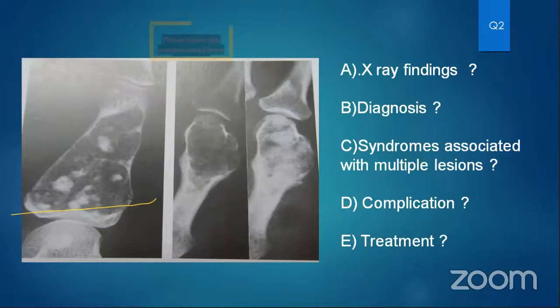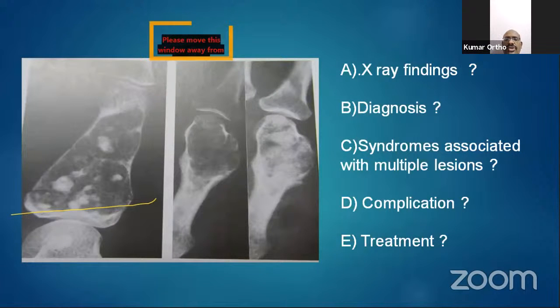Okay, sir. After that, you should say the diagnosis. Also, you have to tell whether there is any intra-articular extension. It may be pathological fractures or intra-articular extension. We are always very interested in knowing whether there is intra-articular extension of the tumor or cortical breach. These two words, and also cortical erosion or pathological fractures, matter because the treatment differs if there is articular extension or pathological fracture. Okay, last point: you always have to mention any complications. If there is a complication, you have to tell it.